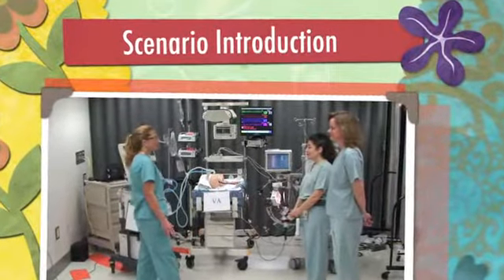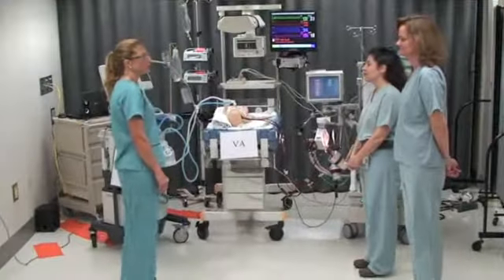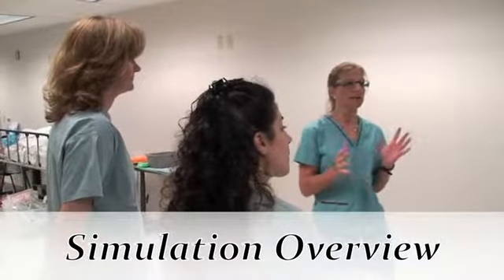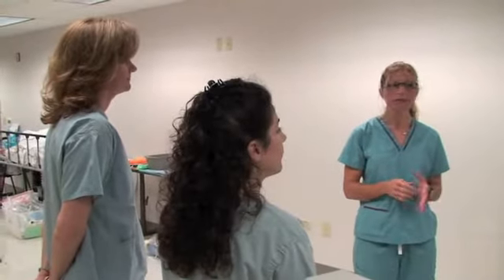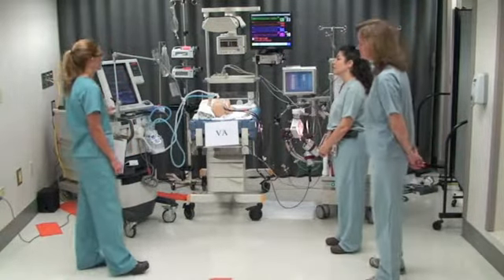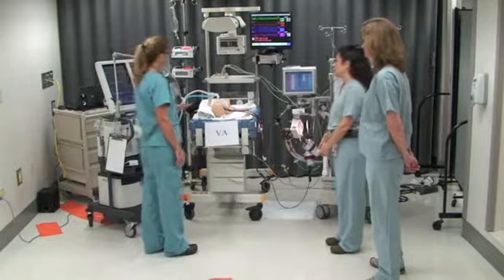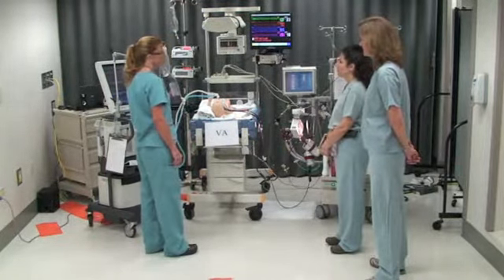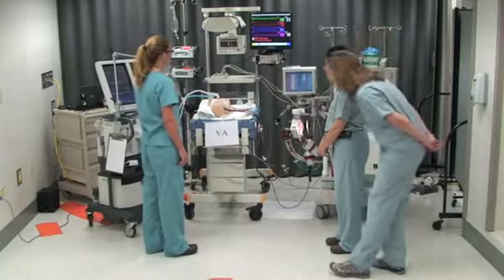So welcome to simulation. This is going to be your opportunity to practice some hands-on learning skills for ECMO. We've set up this bedside like we would for our program in the intensive care unit. You will have a ventilator with emergency vent settings posted, an intubated patient on VA ECMO. All of the scenarios will be run on an infant. You will have IVs running, medications.